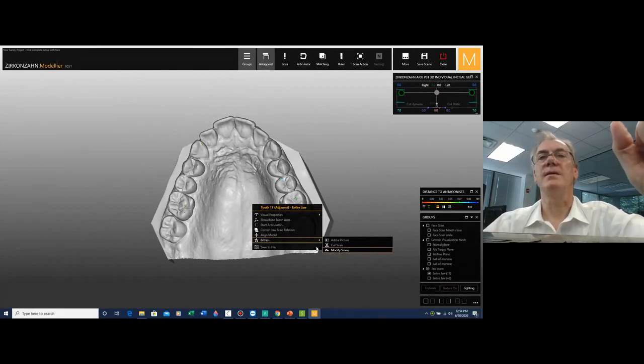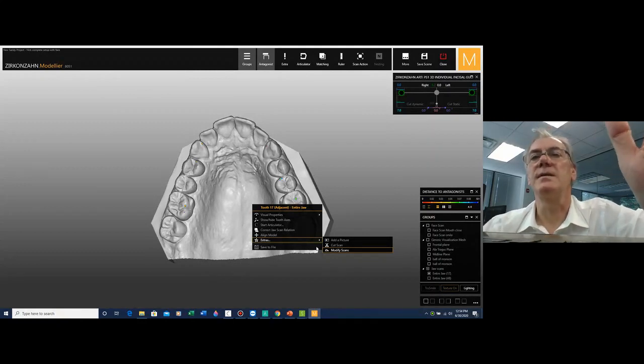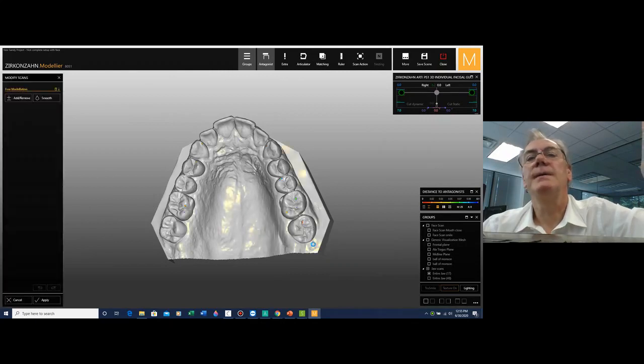It's a little bit slow today, the computer. Usually it clicks and it opens up immediately. Now it's doing a little bit of heavy calculation. I also wanted to see what happens on the other side when I add it on. Okay.